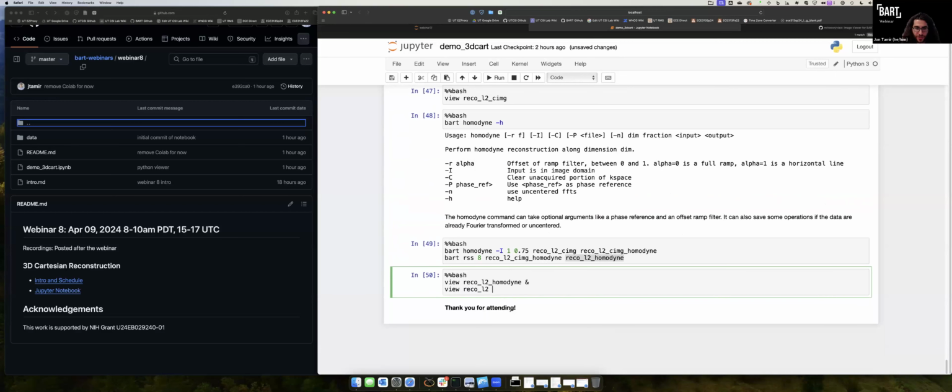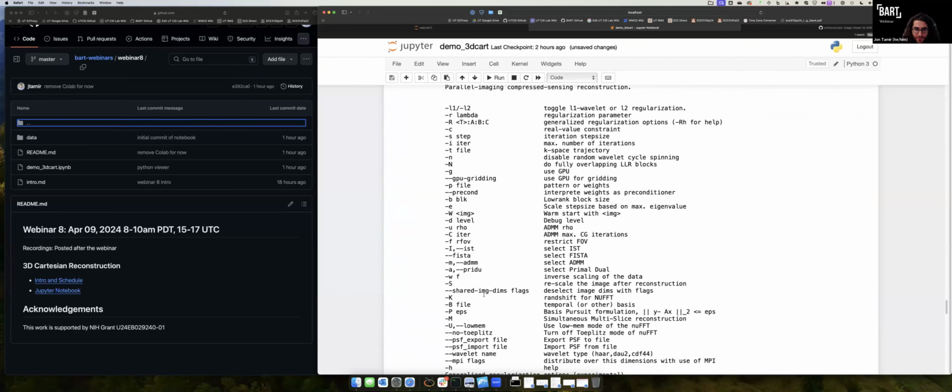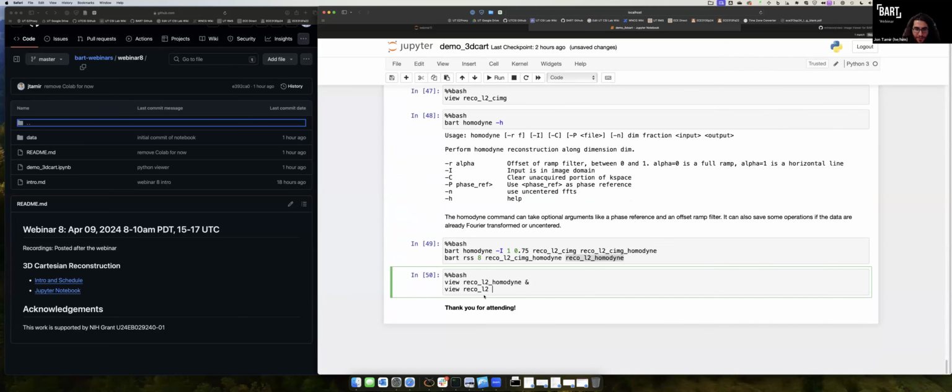One thing that I didn't show here, what I would call a final result, is to take all of these commands we ran and compile them into a single bash script so that it can be run on a new data set more effectively. The notebook is useful for testing, and eventually we can move out of the notebook. But I'll go ahead and stop sharing here.